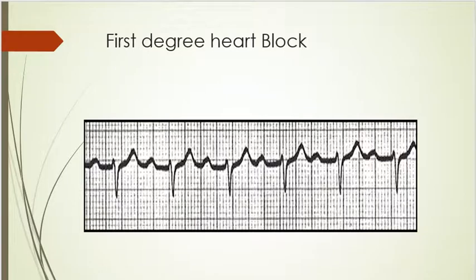It's just simply a delay. The P wave occurs for every QRS, so we know there's no block, but they call it a block. It's just because the PR interval, every P, is always greater than 0.20. The size and shape of both the P wave and the QRS may vary, but that PR interval is very long.